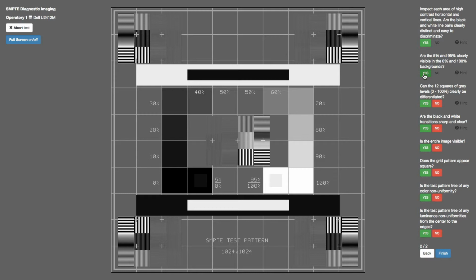If the ambient light level is low and you still cannot see the 5%, you may have to adjust the brightness and contrast of your display manually. Ideally, you should perform a calibration of your display through the DICOM Grayscale Standard Display function. This will ensure that the display is performing optimally. Perfect Lume Dental software and the X-Rite colorimeter can be used to perform this calibration. Check out our website if you want to purchase this product.